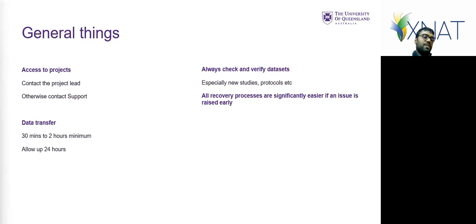One of the focuses of the service is not just to keep data in a more secure, organized environment compared to consumer flash drives and hard disks, but to make it easier to validate and inspect your data. Like you can click the session, just see the DICOM headers and see whether scans are missing or not. And it's highly recommended to take advantage of this.